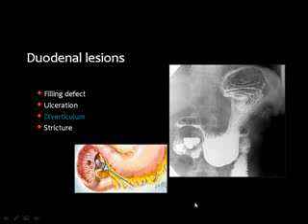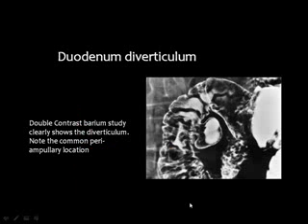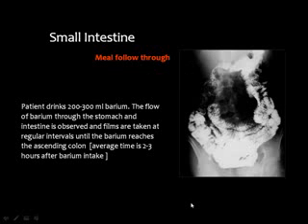example. And duodenal diverticuli usually affect the second part of the duodenum and may be close to the region of the ampulla of Vater. Then they will disturb the biliary drainage and may result in obstructive jaundice. And you remember this case of duodenal diverticulum affecting the second part of the duodenum.